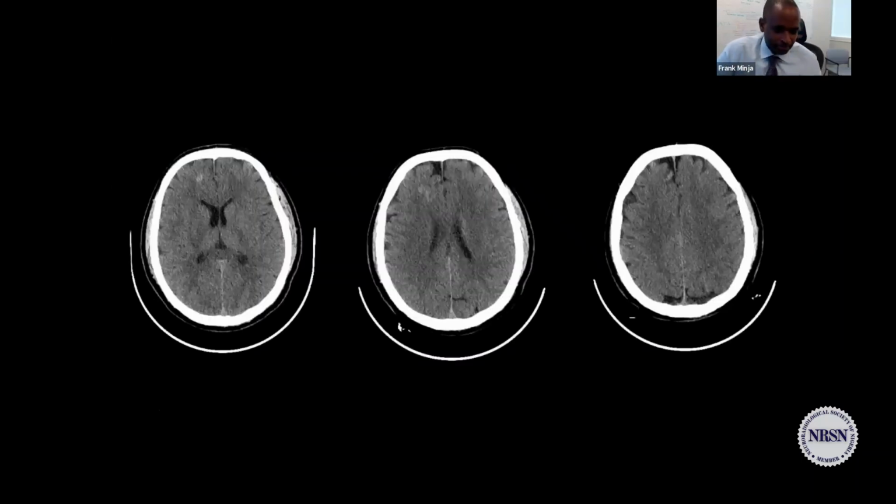Excellent. Now, this is another one. A patient comes in with a headache, and the resident trainee, let's speed up on the resident trainee, discusses a little hyperdensity, maybe stipple calcification in the right frontal lobe. But then I said, oh, I see something serpiginous. All right, so I am dealing with something vascular. So those are the clues.